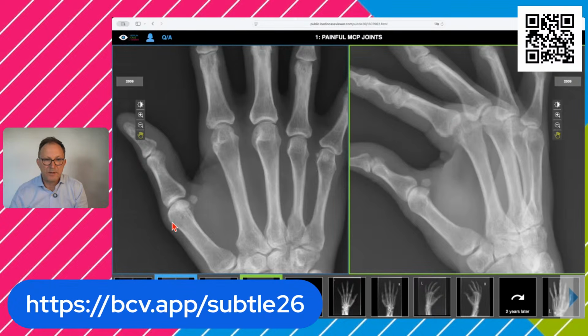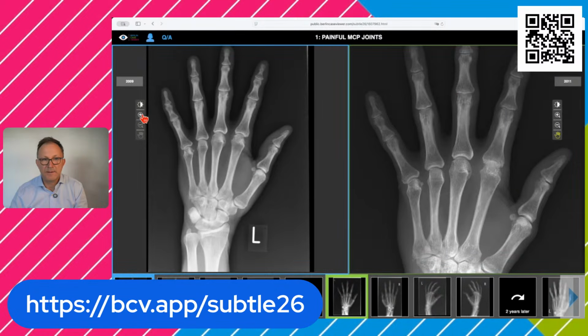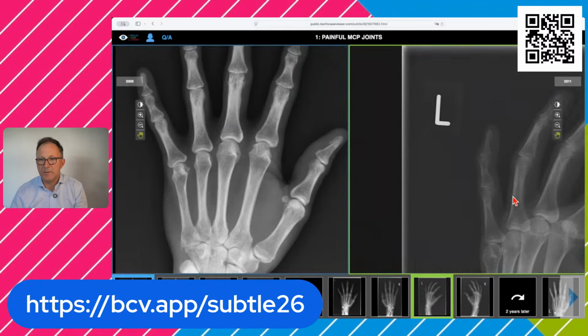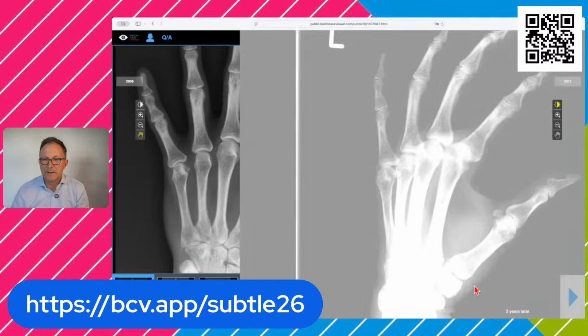All right, so looking at the left hand, we have then the follow-up 2 years later, and you can see that already 2 years later, we now see clearly that the joint space is gone. There's bone on bone here. And in order to search for bony destruction, I guess we would need to look at the oblique images. And it's not so easy to see. But maybe there's also some cortical breakthrough. I'm not sure here in this particular case. Okay.